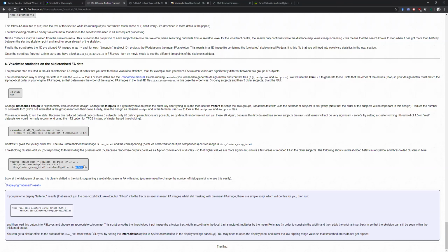We don't cap out at 0.05 and just show between 0 and 0.05. We're showing the reverse of that. And so 0.949 up to 1.